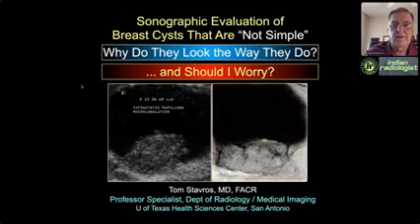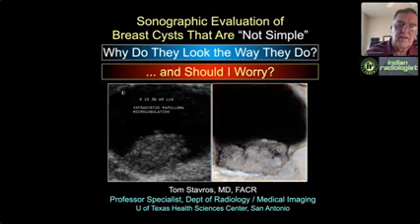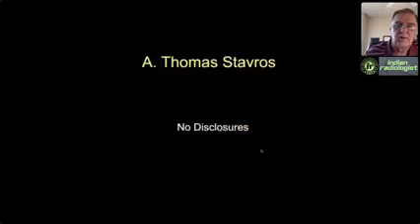What I'm showing here is a nice large section pathology slide, and what I want to show is that I make it grayscale and video invert it so that white is black and black is white. You can see that it looks a lot like the ultrasound. And so when I show you the correlations, I'm going to use a lot of beautiful histologic color pictures that I'm going to convert to grayscale and video invert so you understand why things look the way they do.